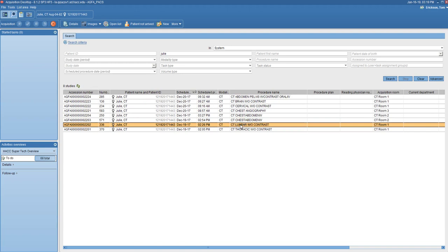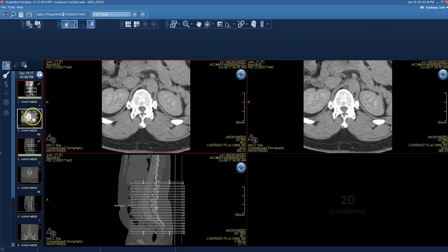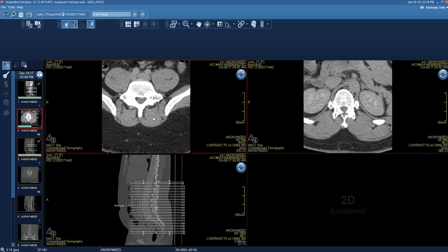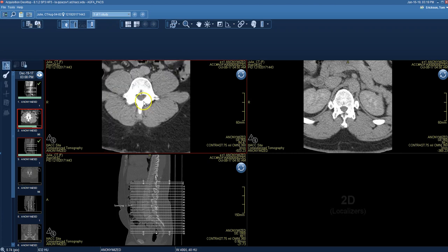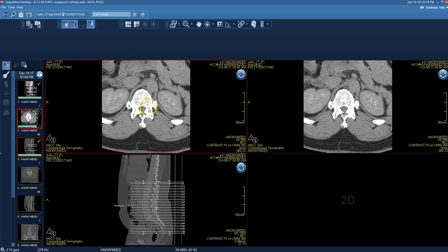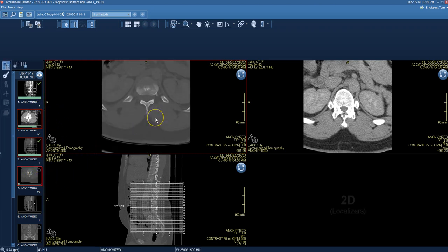Finally, let's do a lumbar spine. So what plane is that? Axial, yes. So this is your lower back. You can see the vertebral bodies. Spinous process out the back. Looks like they did a second set. These are in bone windows.